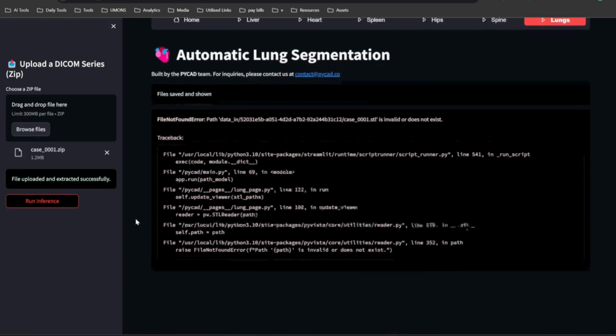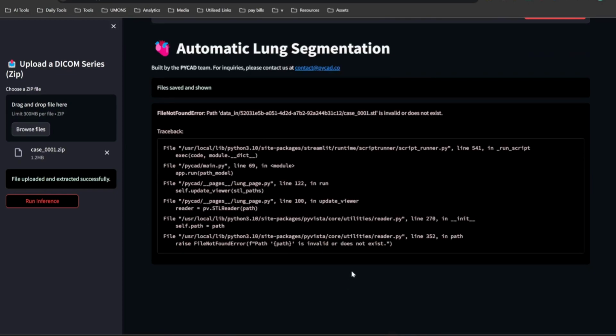Yeah. So this is the error message that you will get. It was my mistake that we didn't fix this, because the code is searching for the STL files which don't exist. So I just need to adapt this. For the moment, it is not something that will stop the application. You will just get this error. You can ignore it here, go to the next scan, okay?